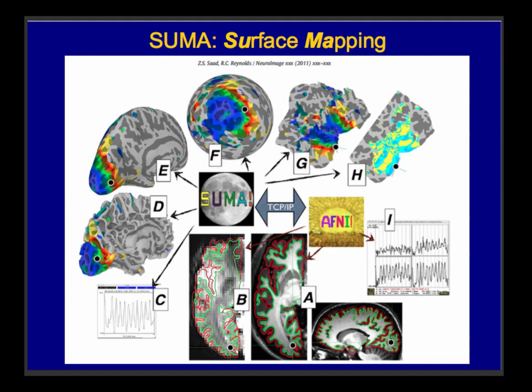We can make different kinds of projections in the same way that when you have a textbook and you want to see a picture of the Earth, it's a bit hard because the Earth is a three-dimensional shell and you want to squash it onto a page. Here we also have to squash things onto the computer screen, but we can do different projections just like Mercator and all these different kinds of map projections to play around with the data so we can see different things simultaneously and how they relate.